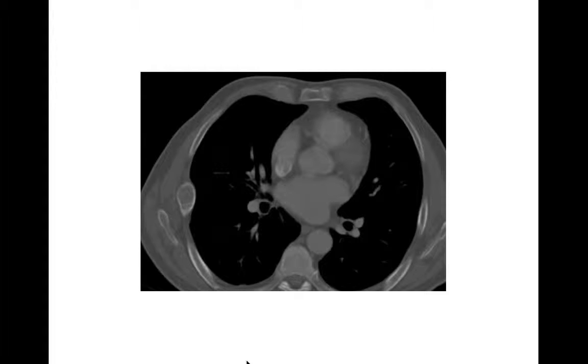An axial CT bone window shows an expansile rib lesion on the right here. It's geographic, it's a narrow zone of transition, it's lytic expansile. There's no fracture, there's no periosteal reaction. This could be lots of things. It looks fairly benign here. Benign expansile rib lesions certainly could be an aneurysmal bone cyst.